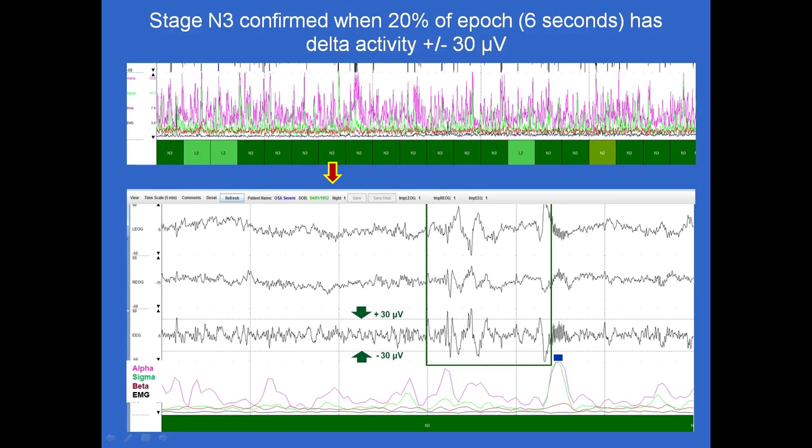The amplitude of slow-wave sleep is attenuated at the frontal polar sites. The 30 microvolt dashed lines assist in the confirmation of delta activity similar to the conventionally measured 75 microvolts.